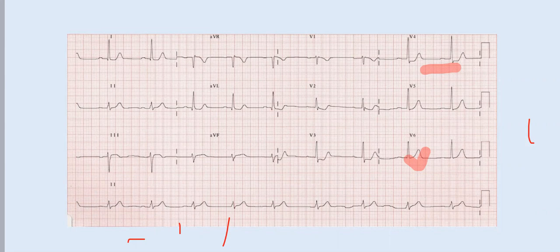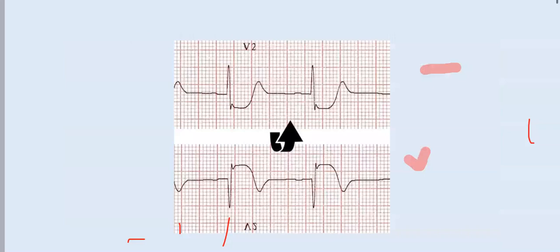So a patient comes with chest pain and this is the ECG, which was declared as normal, لكن the patient is having posterior MI. Okay. مشكلة posterior MI بتظهر في V2 like tall R, ST depression, and upright T, which is considered mirror image of Q wave, ST segment elevation, and T wave inversion. يعني إذا قلبت ال ECG على الميرور, that's what you get.